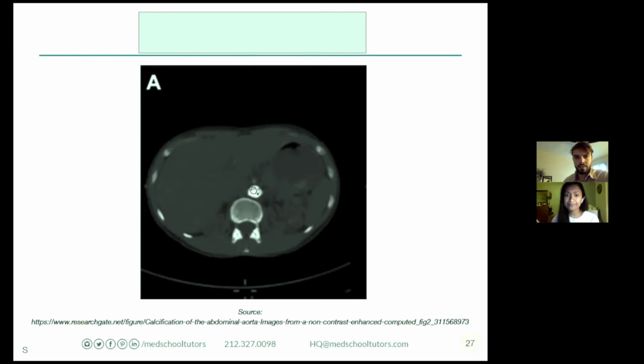Always the aorta. But a lot of people might think, and I've gotten this question several times, is this just a contrast-filled aorta? And what I'll say is, all this whiteness is actually calcification. And the reason that I know that is twofold. One is that it matches the periphery, the bone structure. It's a very similar Hounsfield unit to the bones. And also, it's very irregular.